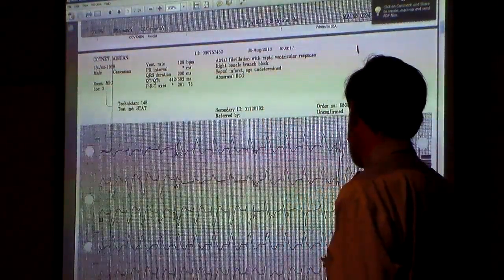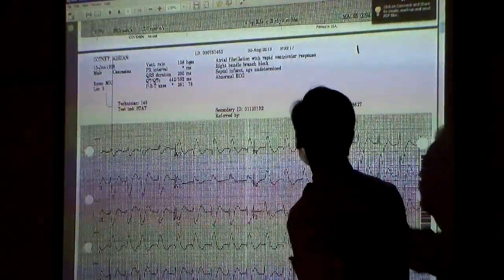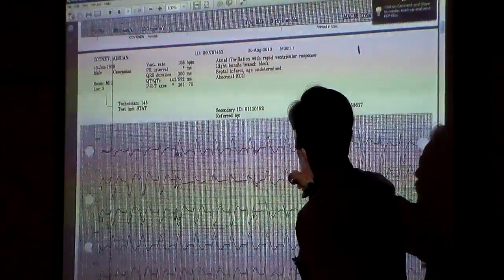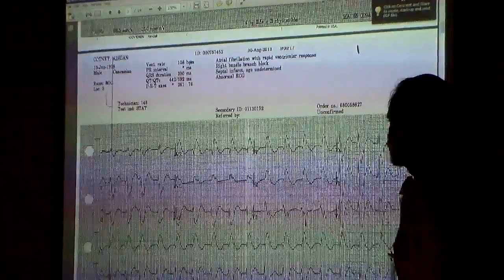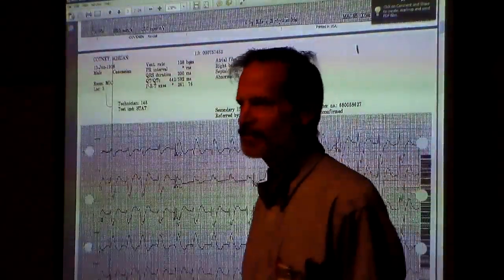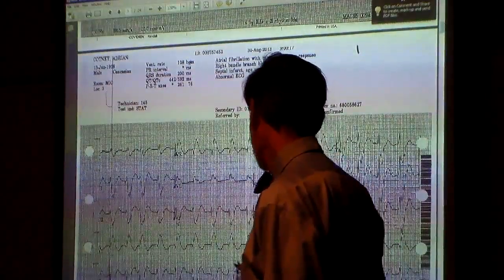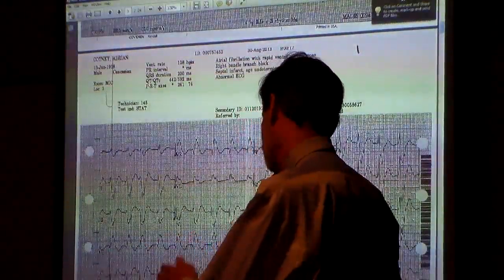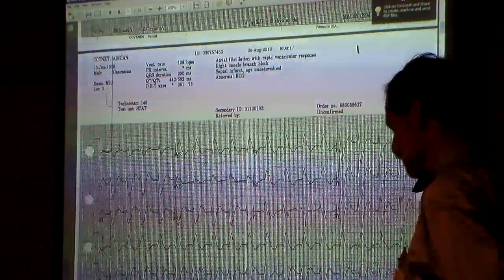Doctor, what about the width of the QRS? Just with the width of the QRS, that would be pretty wide even for a bundle branch block or IVCD. That's one thing that helps you for VT. Once it gets up way above 0.12, that favors VT.